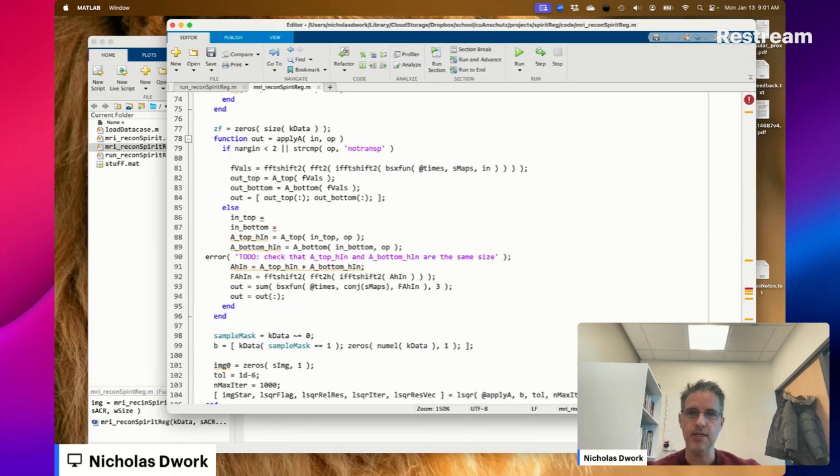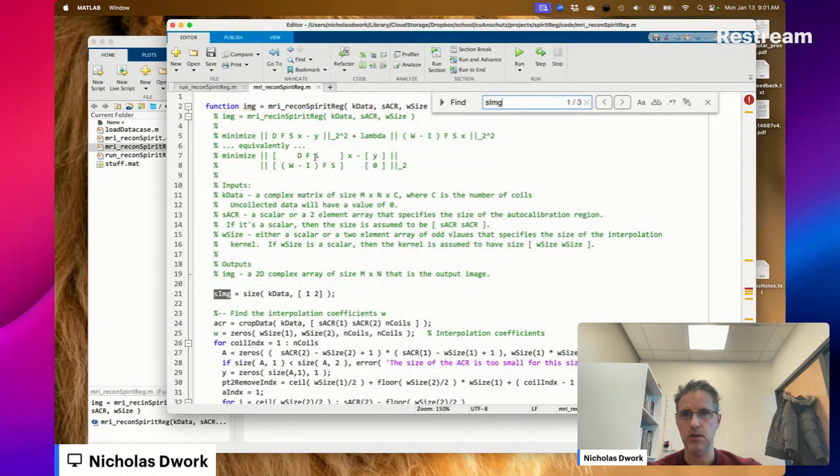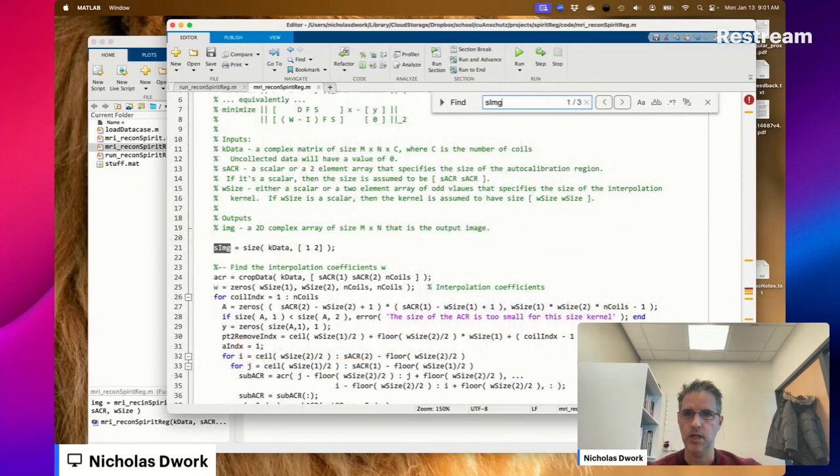And then in here is a vector, but this is taking FFT2, so we need to reshape in to the size that the FFT2 requires, or that this multiplication by SMAP requires. What size is that? It's the size of the image. I don't think we yet have the size of the image. Oh, we do? Nice.